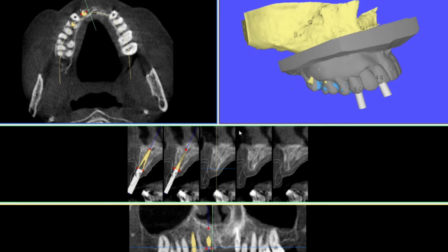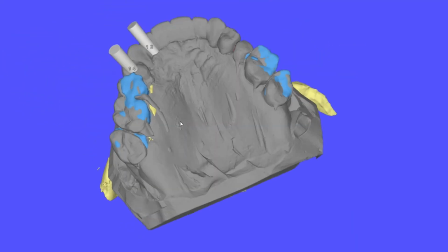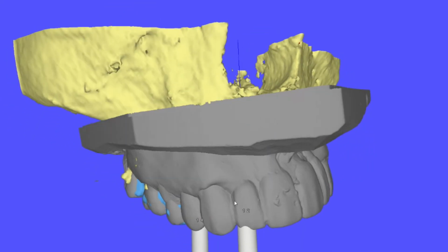And we are now able to go to screen 4, and we're going to look at that larger, and we're going to right click on it, and we can see how that is lining up in there. And again, we may well want to change that a little bit and just change the view there.